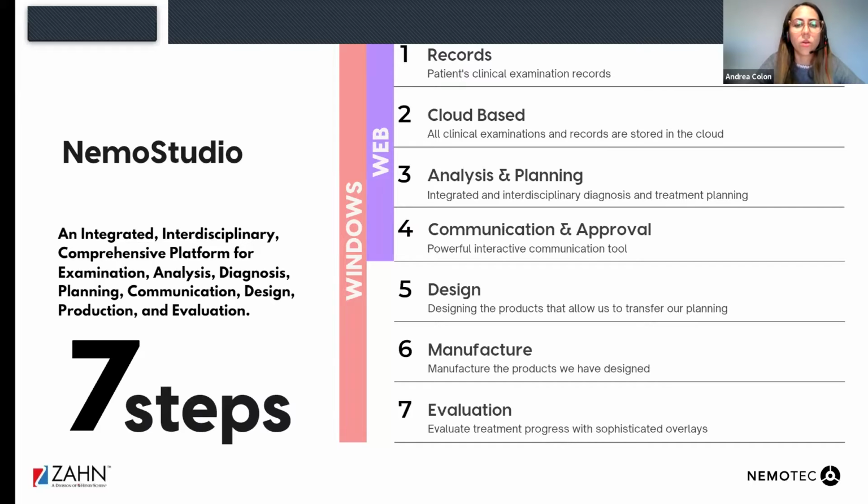You have the possibility to input records, do analysis and planning, full diagnosis, communication and approval, design, then go to manufacture, and also keep the entire history of the patient over time, planning in the different stages of the treatment, because you can keep all the records of the patient in one platform. Then I'm going to show you how it works.